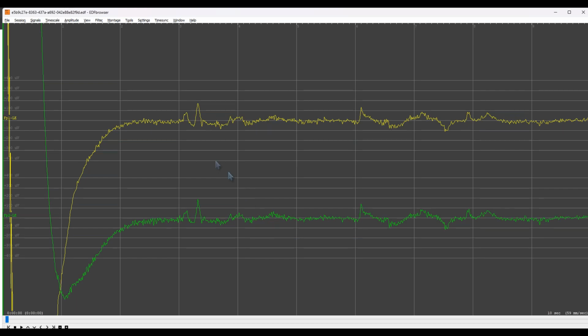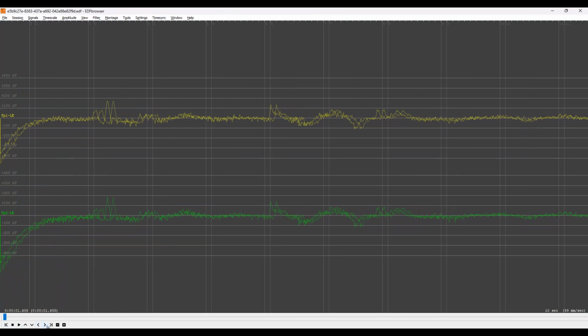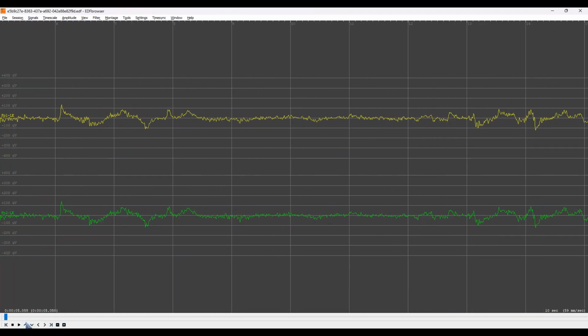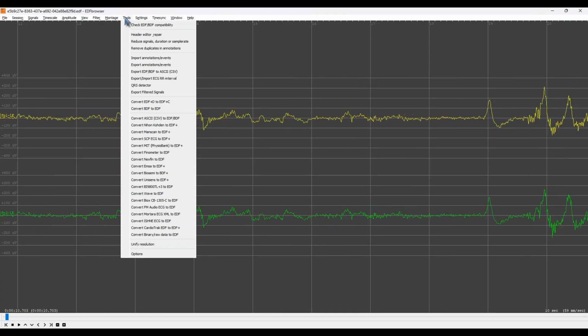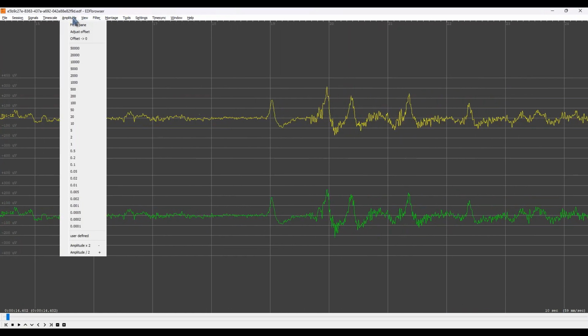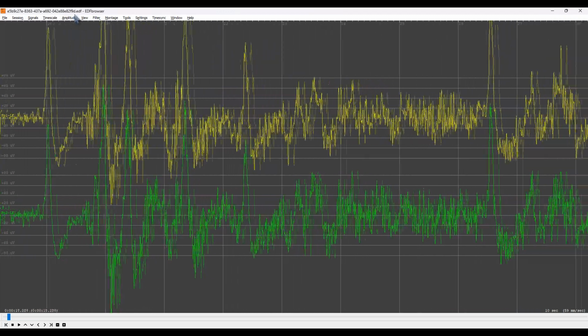Now, currently, this software, because I've been using it and going back, just playing around with this, is remembering the folder that I told it to go to last time. But again, you could go to your desktop, find the shortcut for brain maps. When you get there, just come back one, go into training sessions, and then these are all playable files. So all you would have to do is click on that, choose Open.